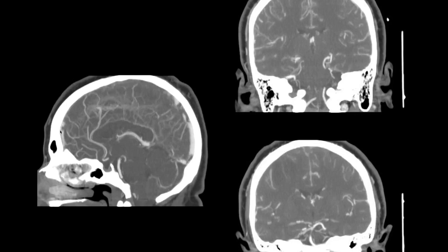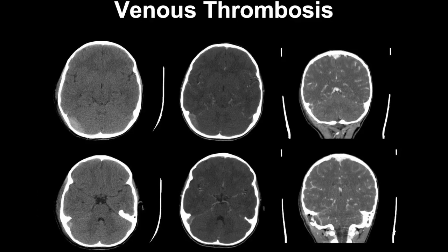And you can see here that the superior sagittal sinus fills up, perhaps a small arachnoid granulation, and then you have a big filling defect. And on the images perpendicular to the superior sagittal sinus, you can see this empty delta sign that is quite characteristic of a sinus thrombosis. And again, here's the superior sagittal sinus, but it could be any of the sinuses. And so here, let me give you an example involving a different sinus. So here you can see that you have this hyperdense transverse sinus. You can see again that filling defect. In that case, it was in a pediatric patient.